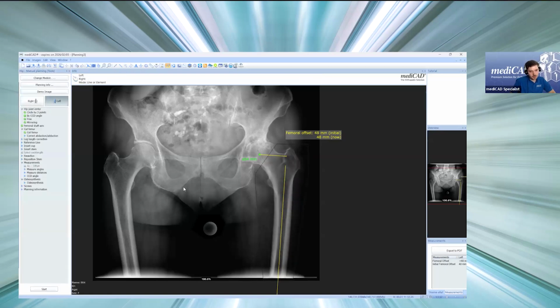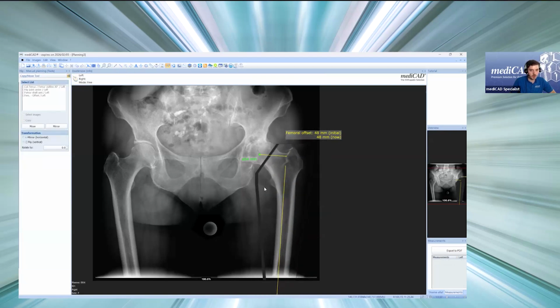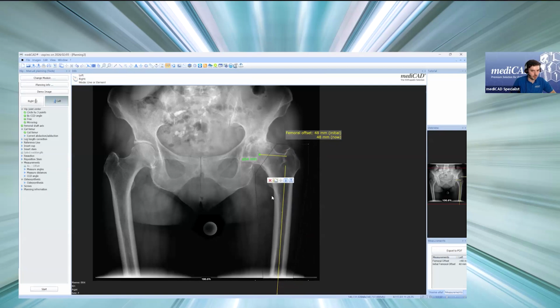What we can also do now, and this is new in this update, the context menu now also works for images. That means we can straight click on an image, go to for example, the quick move right here and move it directly, or even use the copy tool to copy it. What we can now also do with every element, and mainly obviously with images, we can now decide should the image that we move overlap or if it should be hidden behind the other images.